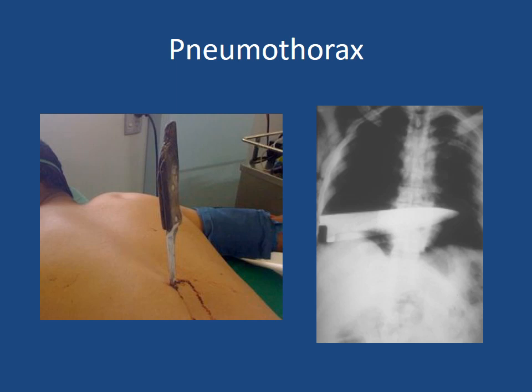The pictures here show an example of a patient that's come into A&E because they've been stabbed. And so what we're seeing here is the patient gets sent around for an x-ray and they leave the knife in situ. You can't remove that knife from the patient until you know what areas of the lungs or the blood vessels or the heart are involved. So you couldn't just take that knife out until you've actually x-rayed the patient. And so if you're working as a radiographer in A&E, then sometimes you may find a patient gets sent around in a situation like this, and you have to take the x-ray with the patient still with a knife in situ.